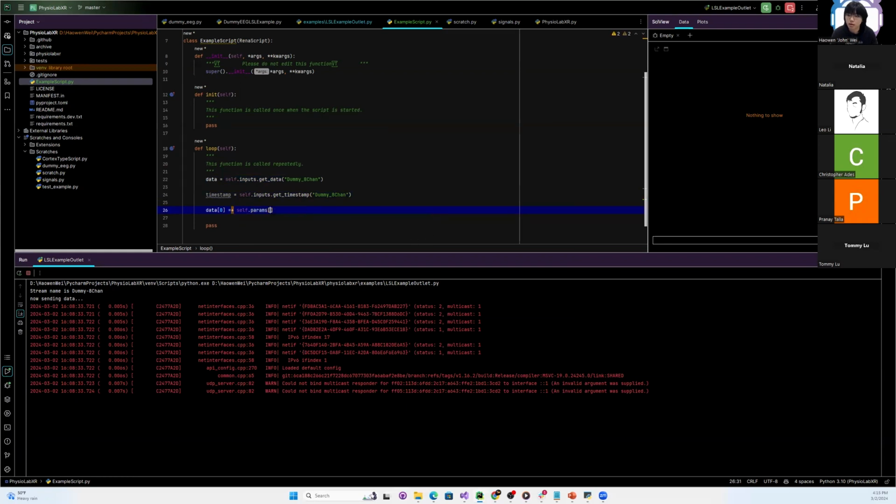So we call it your constant. Okay. So here we are adding a constant to the first channel of the data.